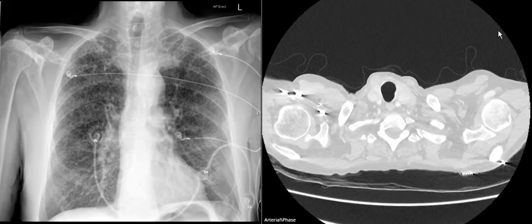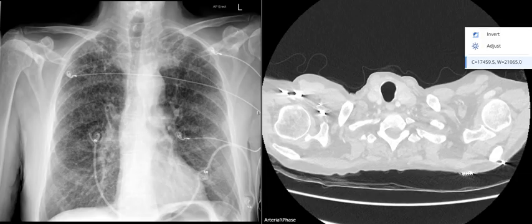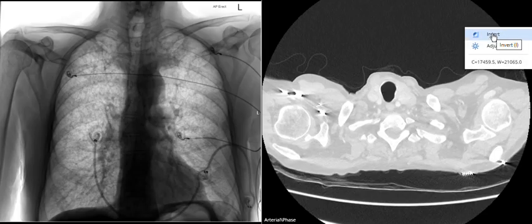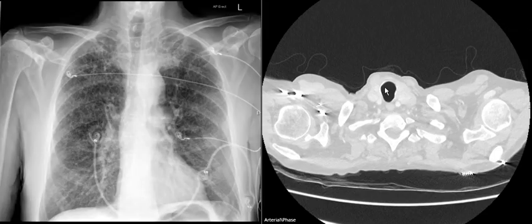Now the walls and voids, if I can click this the right way, look like that. There's just structural walls and voids to the white pixels, inverting the white balance, which is a hallmark of lung destruction in COPD. Let's just go back to where you are. And what it means is over here, so that's the trachea. And again, this is the front, it's the back, it's the patient's right, the patient's left.